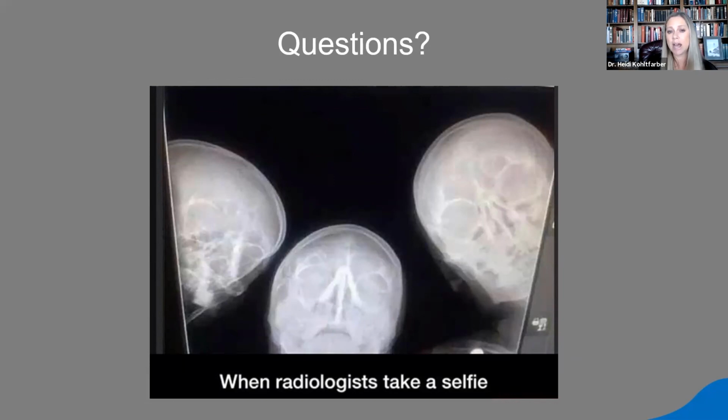Ethically speaking, the entire volume does need to be evaluated. So we do need to be looking through our scans. We can't be taking large volumes and then just concentrating on our region of interest. We actually do need to look at it. And if you see something that looks abnormal, then go ahead and send that on.